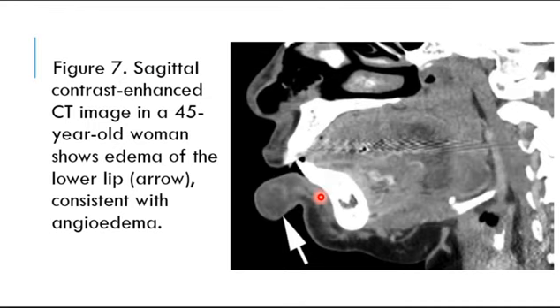This is a case showing edema of the lower lip consistent with angioedema. This is a local focal type of angioedema, which is seen on a neck CT scan in the emergency setting.